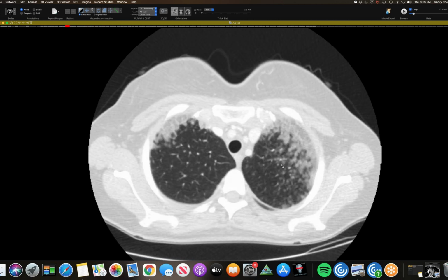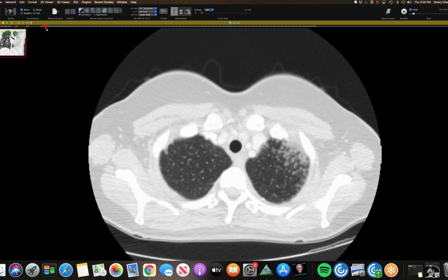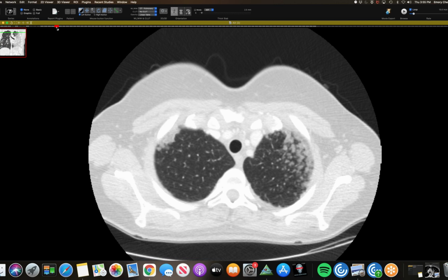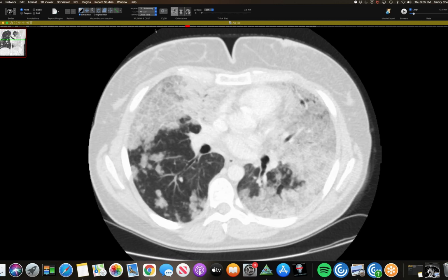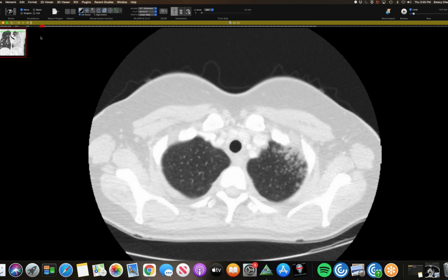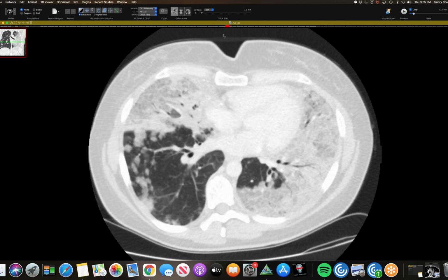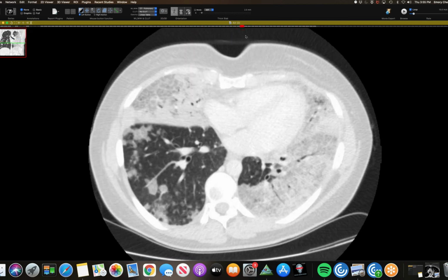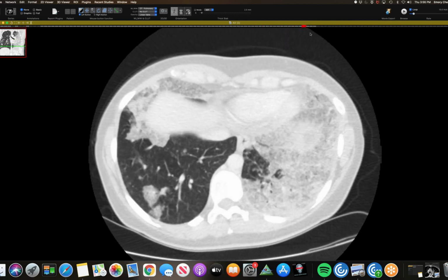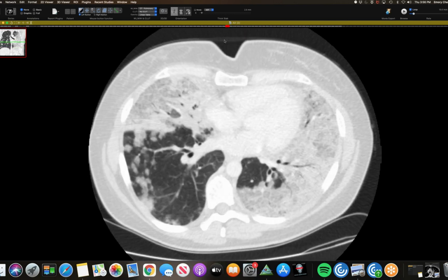But you can see, especially this area right here, COVID never has this kind of acinar pattern. Exactly. Nice, those nodules, right? Those discrete nodules in the upper lobe. When I see those, I always get nervous about adenocarcinomas. And look how low attenuation even the background ground glass is. It's also got nice crazy paving, so it must really be alveolar.